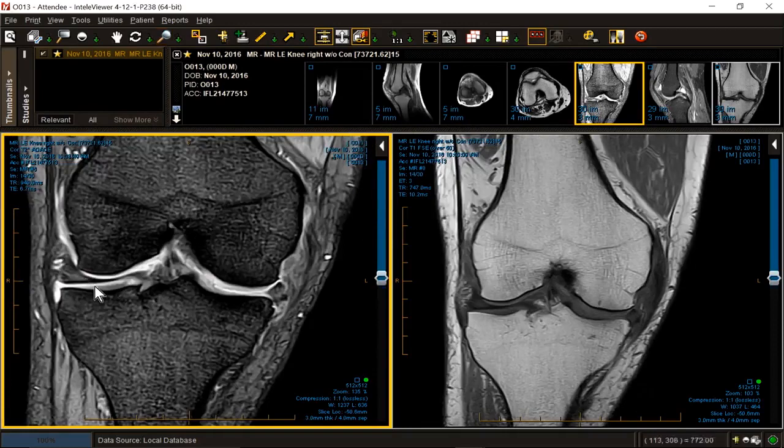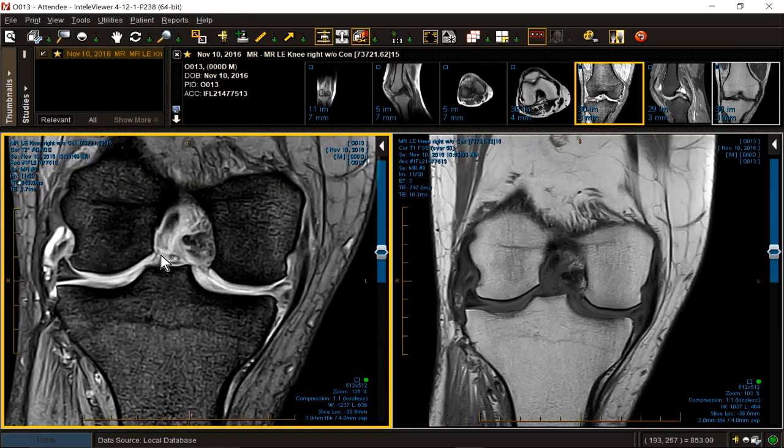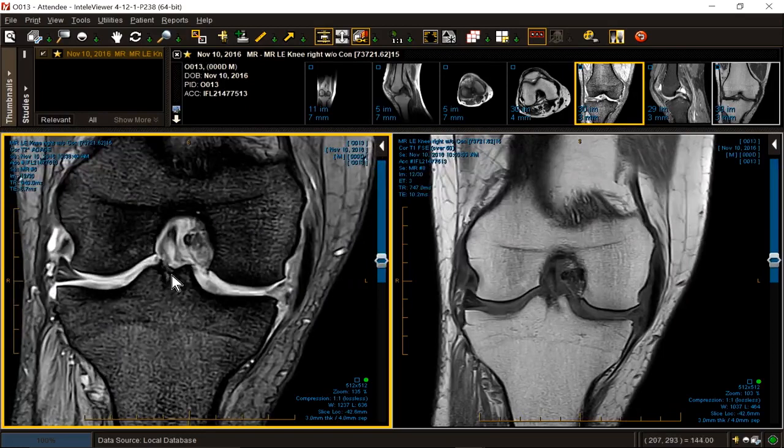Yes, there is some closed signal in the lateral meniscus. We said everybody over the age of 60 is going to have some cleavage signal in the lateral meniscus. In fact, in both menisci. That signal is horizontal. It's not very bright. It may be trizonal. It may communicate in the free edge. It may be closed. If it communicates, I'll call it a chronic cleavage tear, incidentally noted, in the meniscus body commensurate with age. If it's not communicating, I'll say there's closed cleavage signal commensurate with age. End. Goes in the body, nowhere else. Done. Don't forget to look for central chondromalacia, which this patient has.